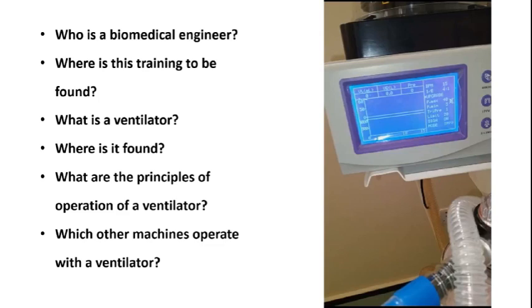If you yourself or your relative who you have taken to hospital needs to be assisted in breathing, the machine that helps with this is what is known as a ventilator. So a ventilator is a machine that mimics breathing, human breathing action. So let's look at a ventilator and then hold the discussion.